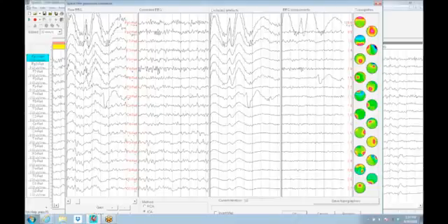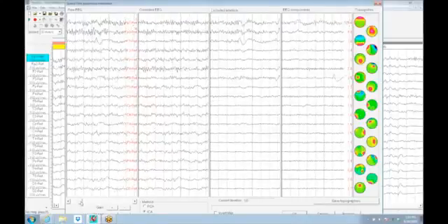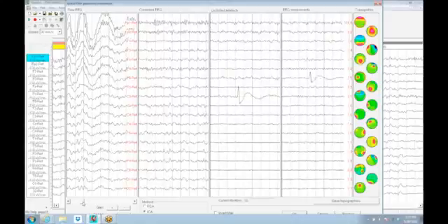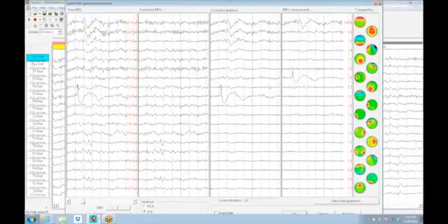It's essentially the same as C4 here, without really damaging it too badly, but it takes out a component that's a frequent isolated C3 blip. You can see how often it cruises through the display here as you scroll left to right.